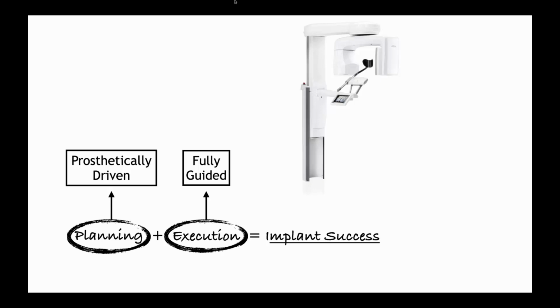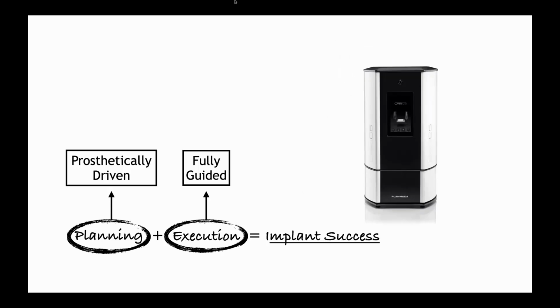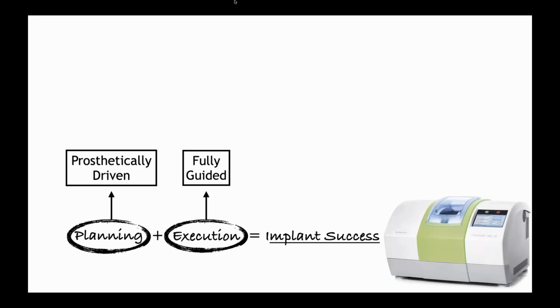However, if you want to continue the digital workflow beyond that, you can absolutely 3D print the surgical guide, and indeed we do on a daily basis. And then the final step, if it's part of your practice, is using CAD/CAM technology in order to execute the restoration. So all of those things together, we've had really great success. But from the planning perspective, let's go through that process.